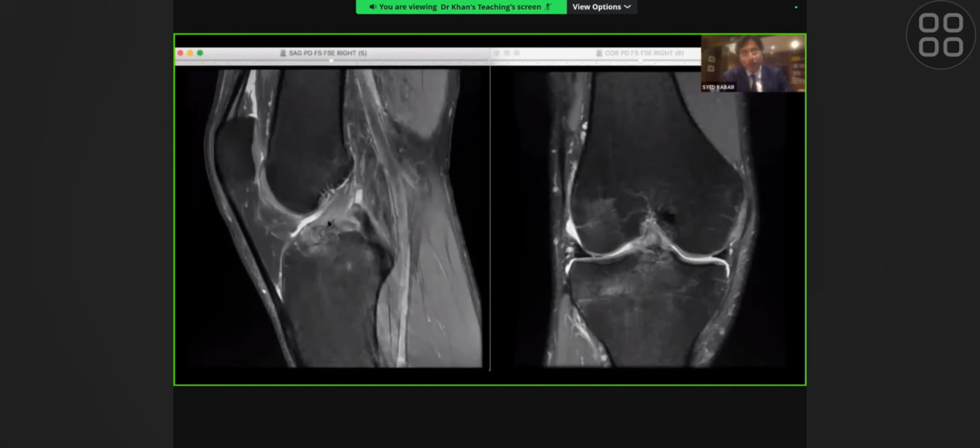But in addition to the marrow edema, look at the shape of the fibers of the ACL. Why is it curving around? It shouldn't be. It should be a nice taut structure. And all of the edema is centered here. So you can't really make out, but I would be really suspicious that there's something going on at the bony footplate. In other words, an avulsion fracture is what I would be thinking of, the tibial component, not the femoral component, because the femoral component, you can still see parallel to Blumensaat's line, which is the roof of the intercondylar notch. So the problem seems to be here, but of course, we will confirm all of this.